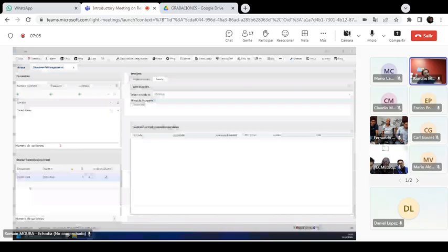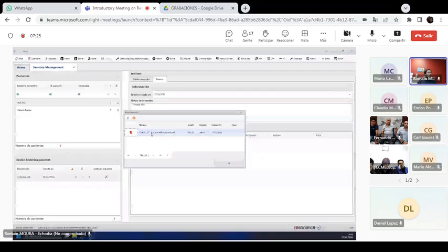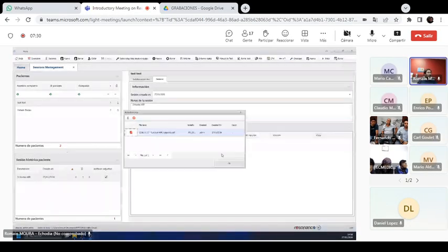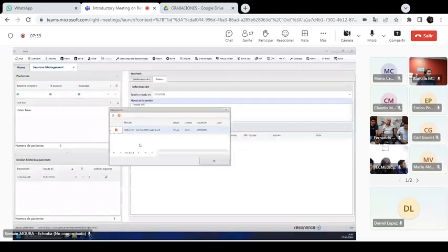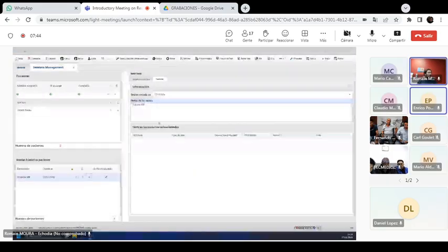And so you will have the session of resonance devices, and you will also have the session with the Ecodia devices in the same place here in the history of the patient. Okay, there is something missing on my side because I didn't try before. I can maybe show from my PC later how that part works.